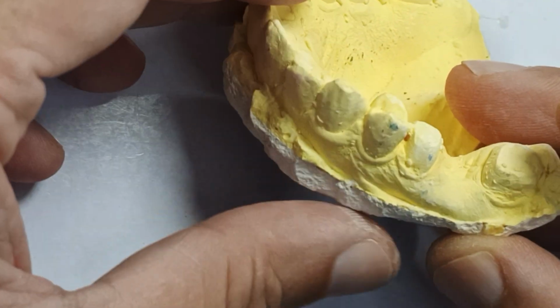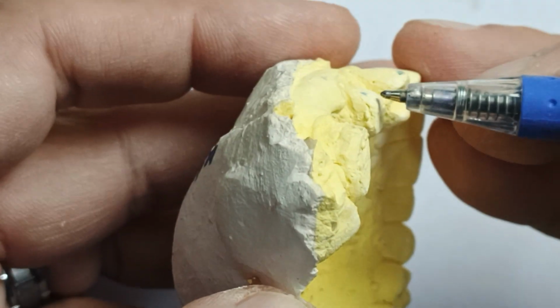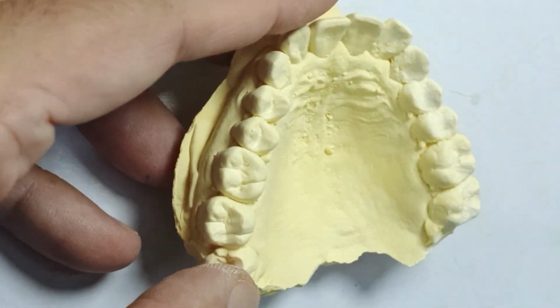Now these are the impressions that are coming to lab. There are no margins, and if you see sideways, what do you see? Where is the prep? There are no margins. The teeth are just cut probably in 5 minutes, and whoever did it is very proud that they can do a prep in 5 minutes. Okay, this is an opposing.